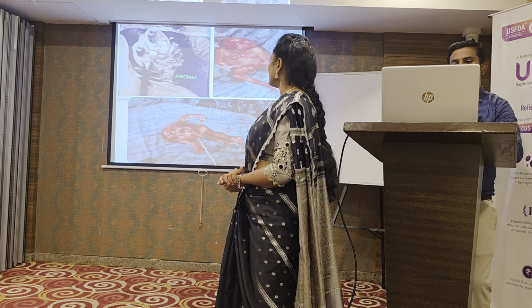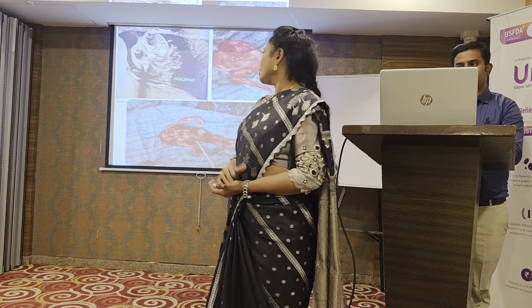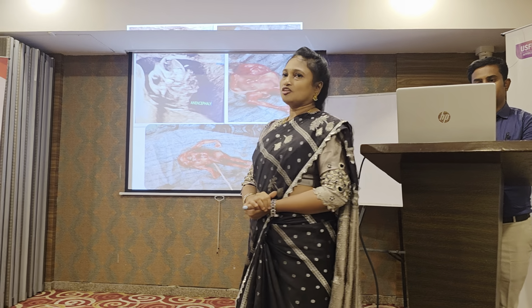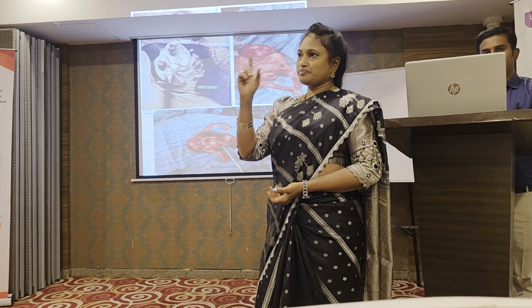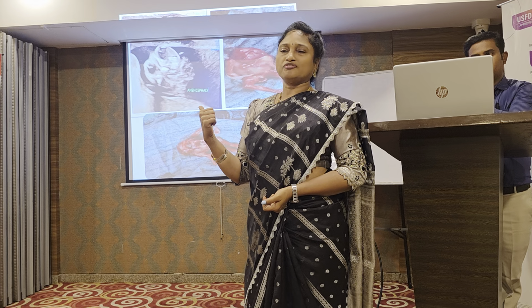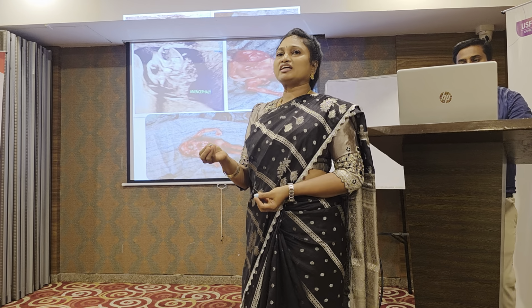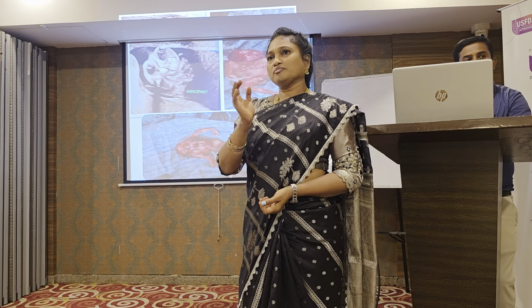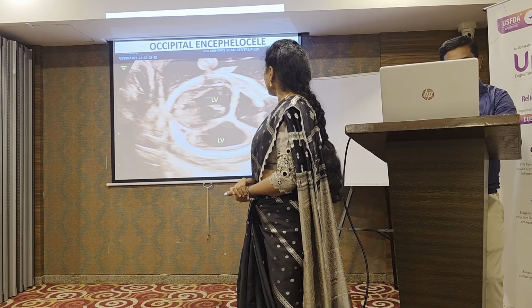Next one. So frog faces, that's what we see. Bulging eyes, frog faces, that's what we call it. And this is a lethal anomaly, so we have to educate the patient, so that next pregnancy they have to use, this is the commonest open neural tube defect, methylcobalamin, DHA and folic acid at least 3 months before they plan their pregnancy, to avoid it the next time. Next one.